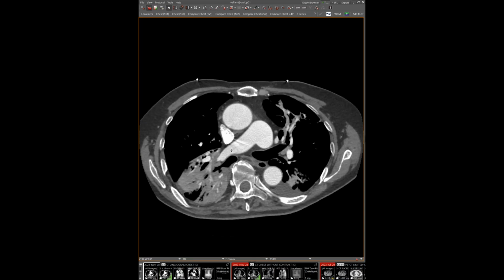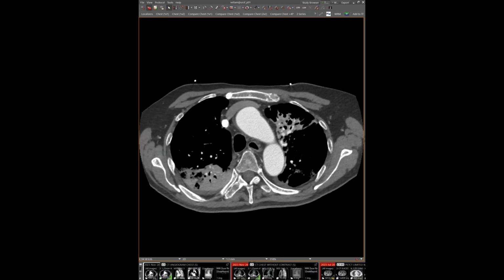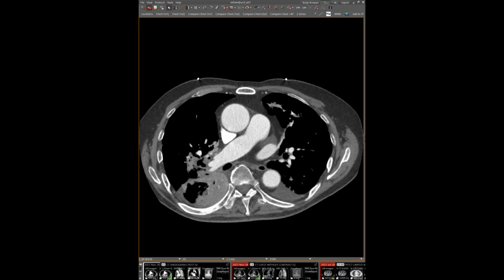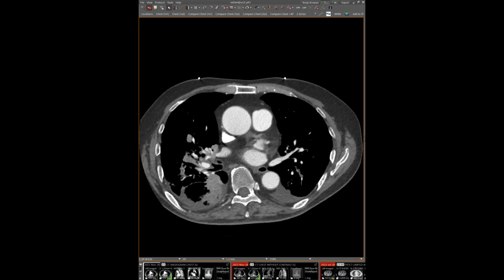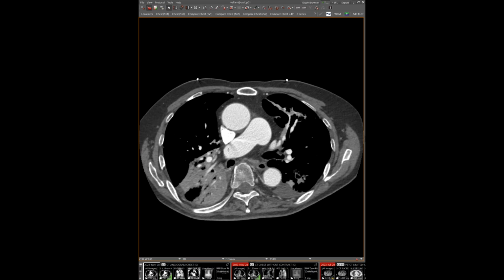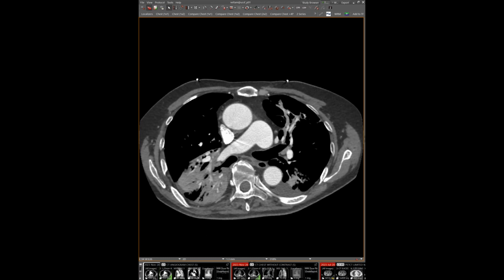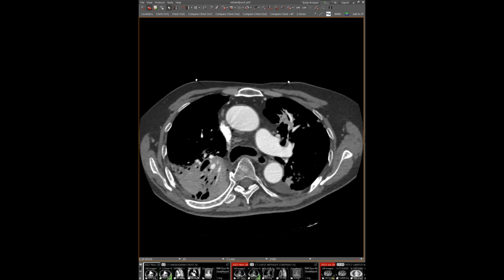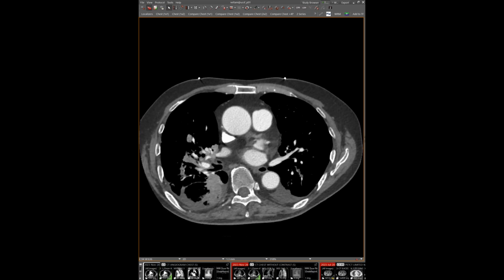So here's our pulmonary artery, right, going into that right upper lobe, which is still in the same position. Arteries, I think, look pretty well patent throughout, so probably not an arterial issue. But if we take a look at the veins, here's our right superior pulmonary vein, and there's this branch of it that gets very, very narrowed right in that area where that torsion is likely happening. The other branch of it actually, I think, looks fine. It is patent throughout. So I would be suspicious that there's at least some diminished flow through that one pulmonary vein, which may be causing all of this airspace opacity.